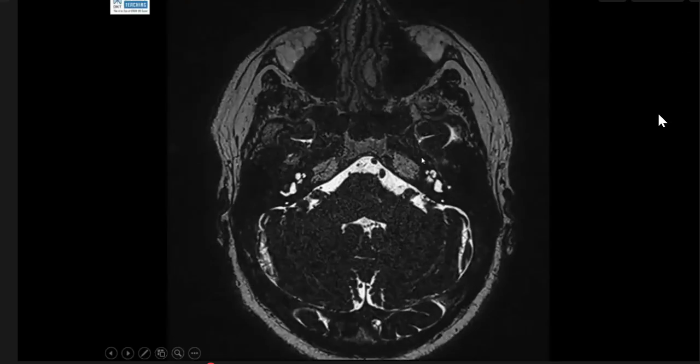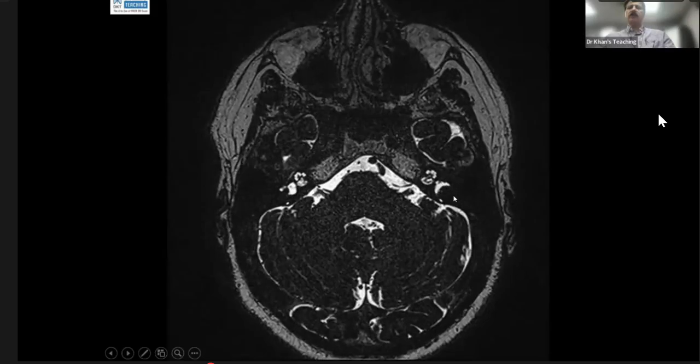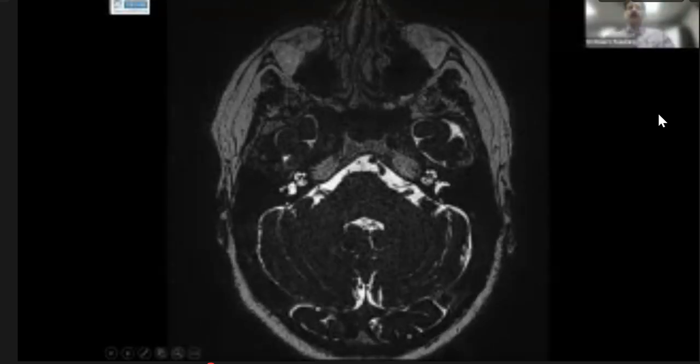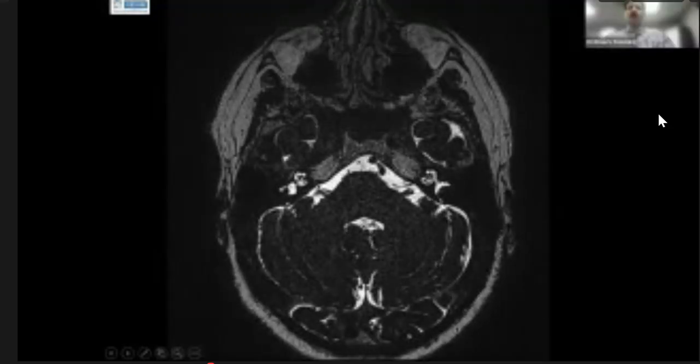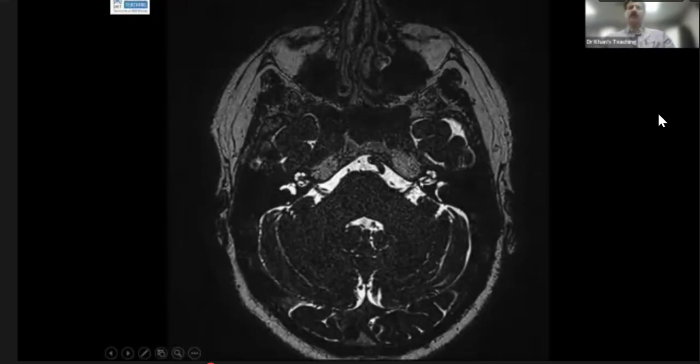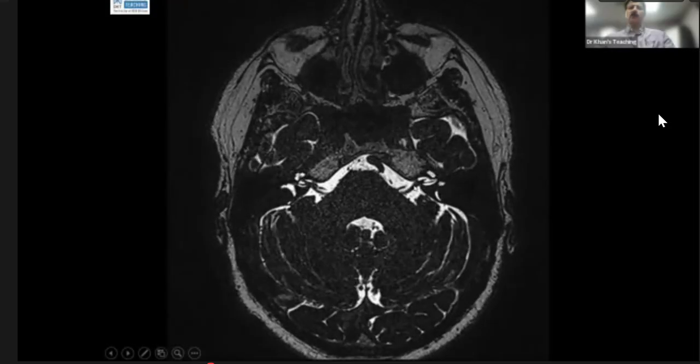Yes, sir. Okay, so if you see here, this is a bit of a repetition, nothing much. I'm sure you already know it. This is that flower. And from the flower, which is the cochlea, you can see this nerve going here. If you trace it backwards, it joins these nerves.